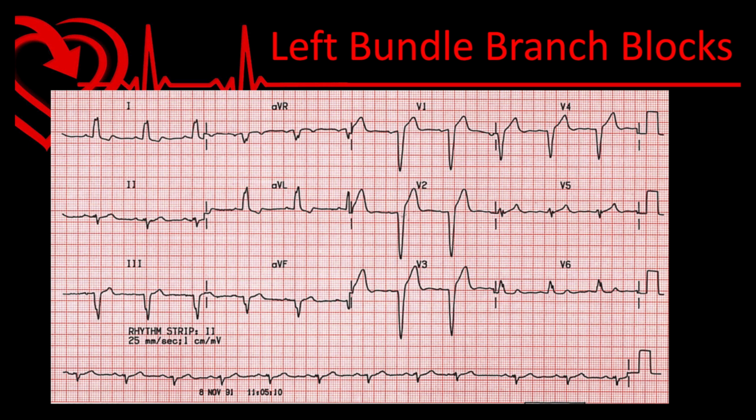So again, we go back to the story. If I'm looking at a patient and I think their story sounds like they're having an MI and I see this, I'm concerned and I'm going to look a little bit closer. If, on the other hand, I have a patient who's complaining of something non-cardiac related and I find this, I'm not going to latch onto this as a diagnosis and assume they must be having an MI.